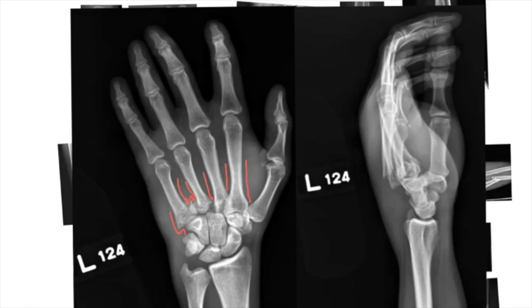And there are different approaches to take to look at smoothness when you're looking at hands and feet. One way would be to look at the entire digit and just go digit by digit. Another approach, however, is to go across at the different levels. So you look at metacarpal, metacarpal, metacarpals, and identify this not smoothness, these fractures down here, and then you do the phalanges at the different levels. And as you go back and forth, you're comparing across the thumb to the second, to the third, to the fourth, and to the fifth digits.